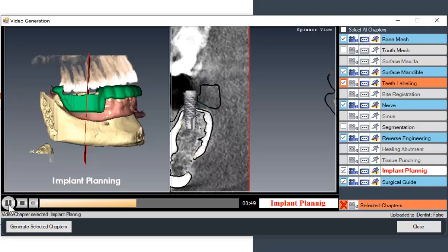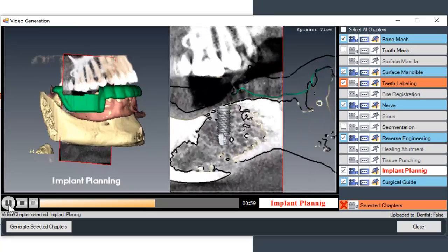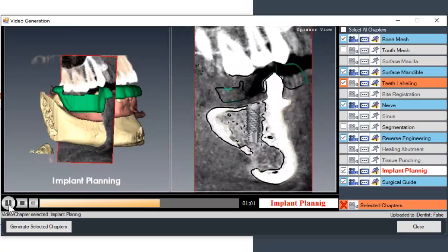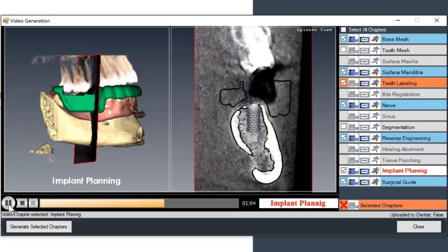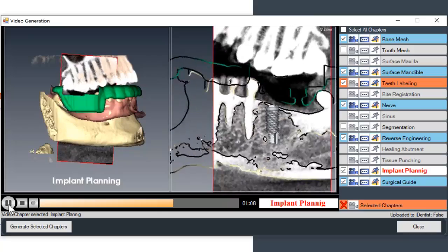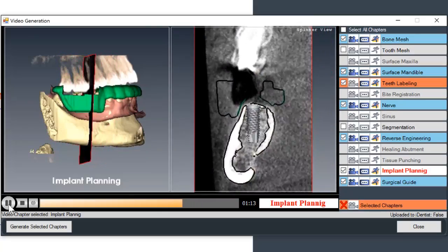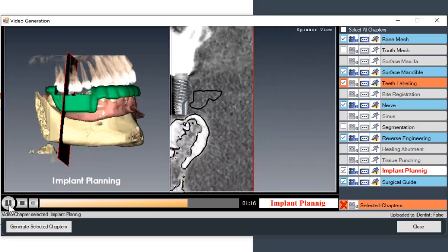Again, Animate and Present is the trademark for the InPronto software. So you get to actually present your case to the patient and show that this has been a calculated procedure. And now there's a whole marketing campaign that's going to go out there to try to educate the patients, to let the patient ask their doctors whether they do actually guided cases and they do it properly like this, and this way to avoid any kind of increased risk for these cases. This should conclude the treatment plan again, and I will include the animations as part of the video that I'll present to you.